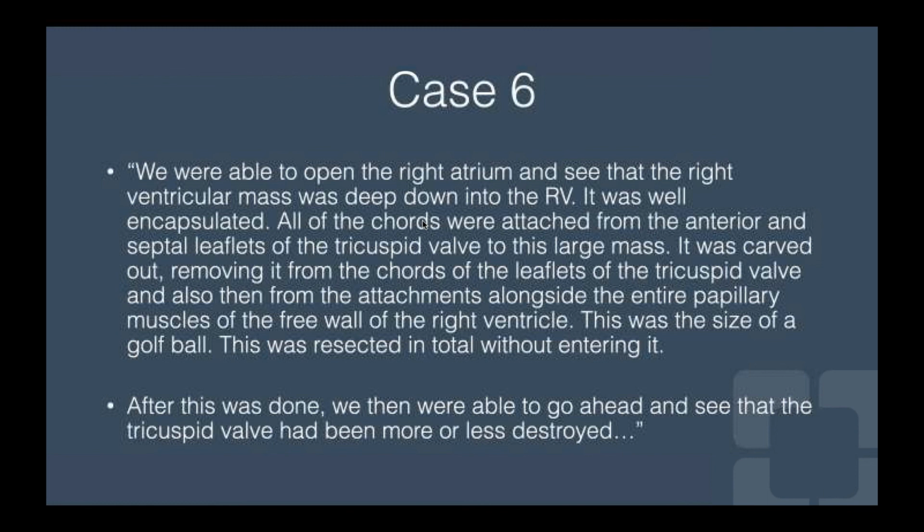This is your PSIR, I believe. So you have some increased signal intensity associated with that mass as well. Again, just very complex, funny signal. This is a T1 post contrast. Again, some areas of enhancement there.